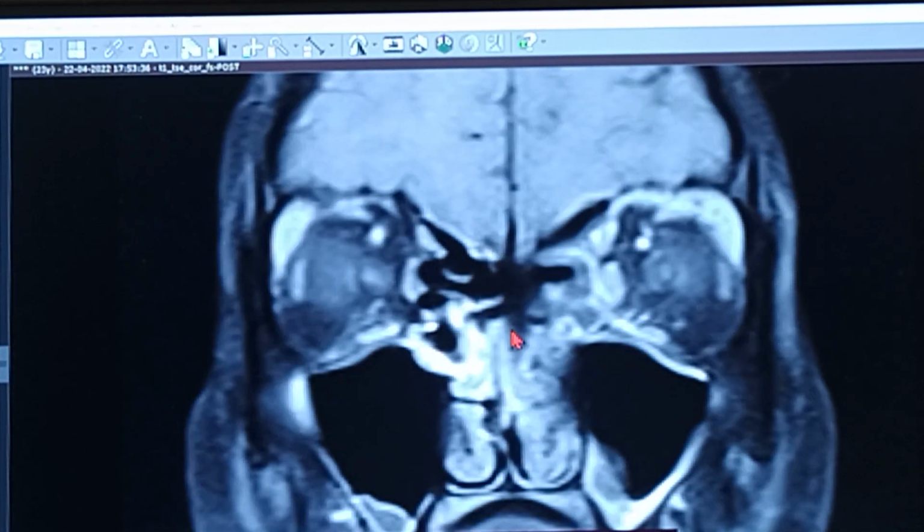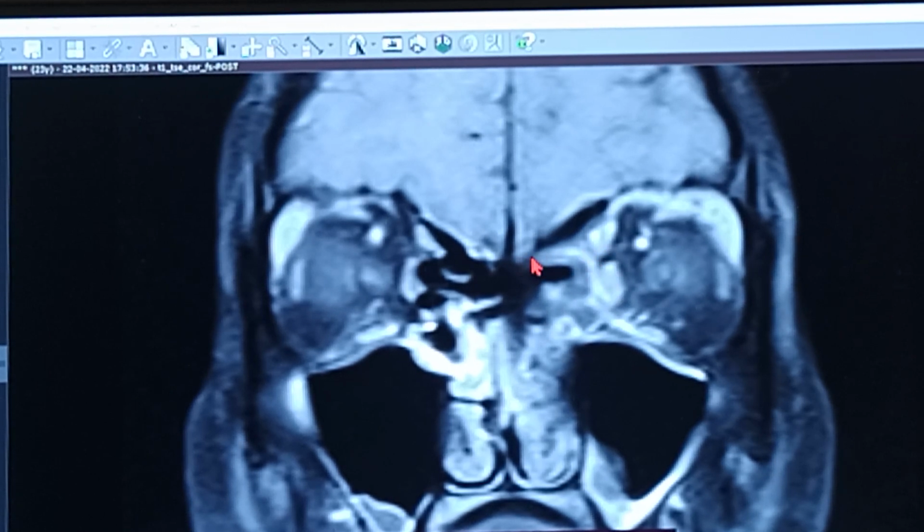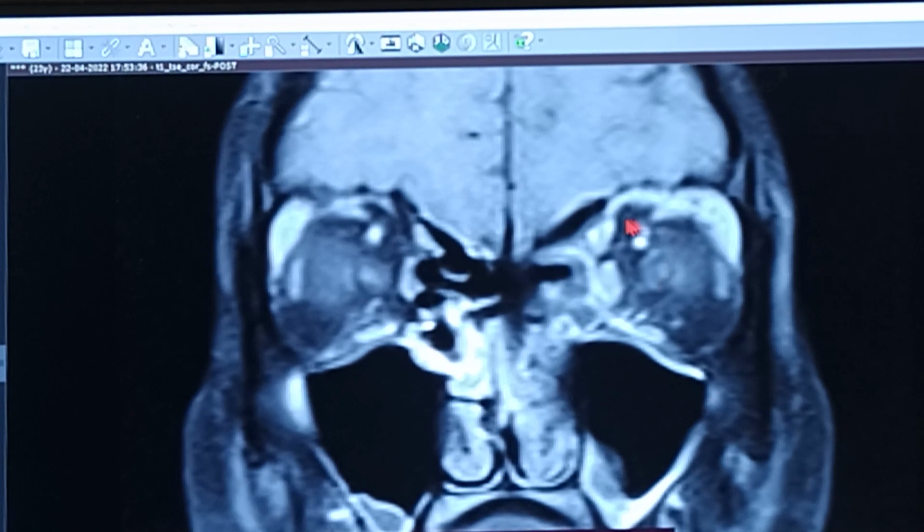So basically we need to see the lamina, the status at the level of the anterior ethmoidal artery, whether skull base dehiscence is present or not, the consistency of the collection and the infective material, and any sort of collection in the intraorbital cavity, intraconal or extraconal.